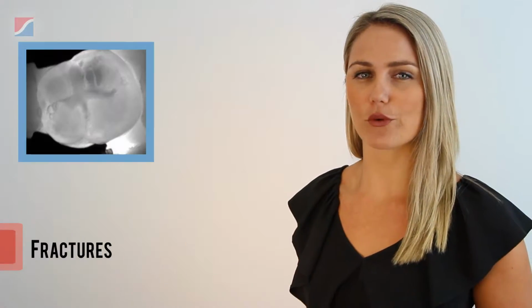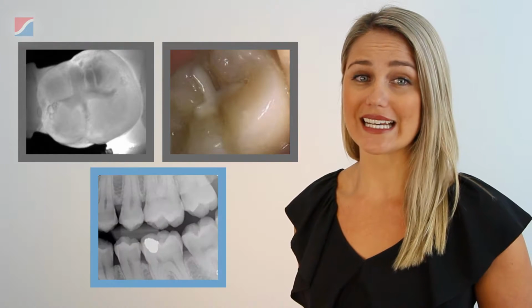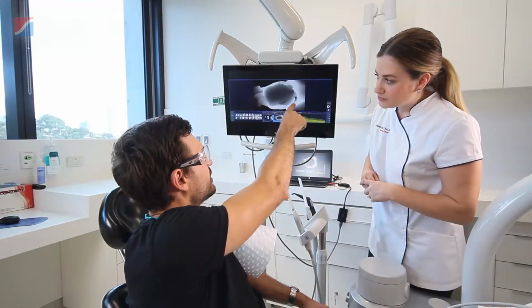This tooth has a small fracture on the cusp. You can then see quite a dark shadow underneath it. Clinically, you can't see too much from the image. Again, the X-ray didn't give us a clear indication that there was decay there. The decay was quite extensive and the tooth as a result was direct pulp capped.